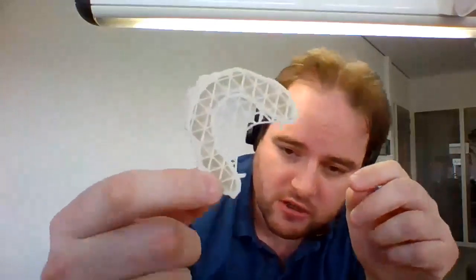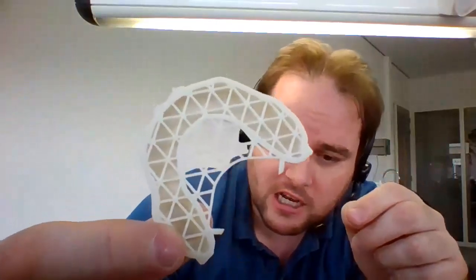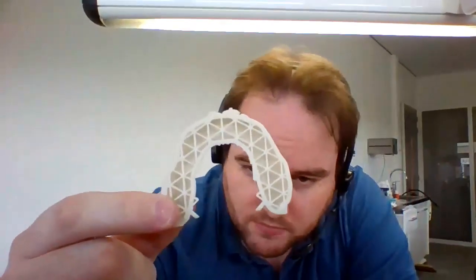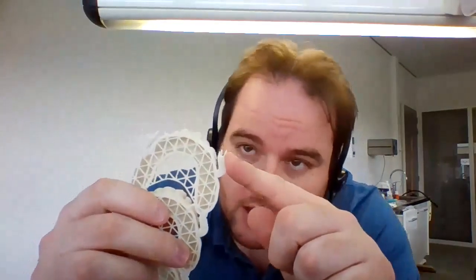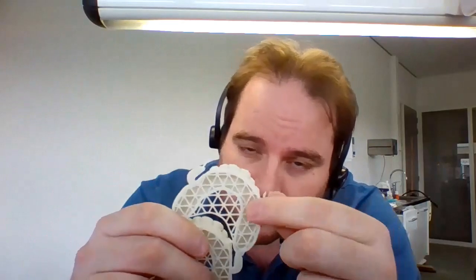The lattice itself, so you can see that there in the back. If you don't like it, it's actually quite easy. You just take your thumb and you push it out. And your lattice is gone. You could still take your tool to remove all the sharp edges. So when you look at the next model, the connectors are still there. Those also you break off really easily. You can snap the next layer off again and remove the lattice structure. So that's how easy it is to break them away and to remove the lattice structure.